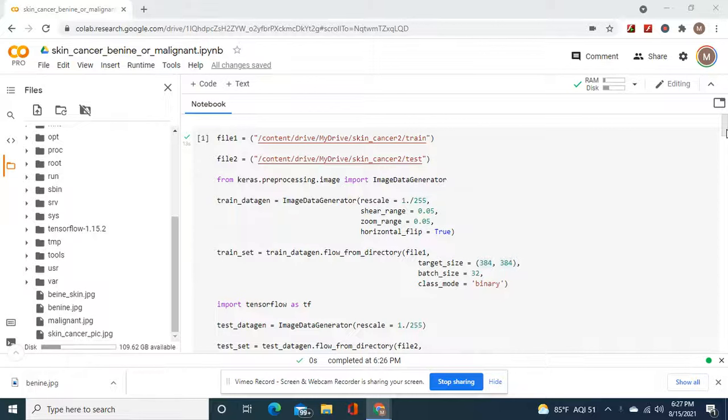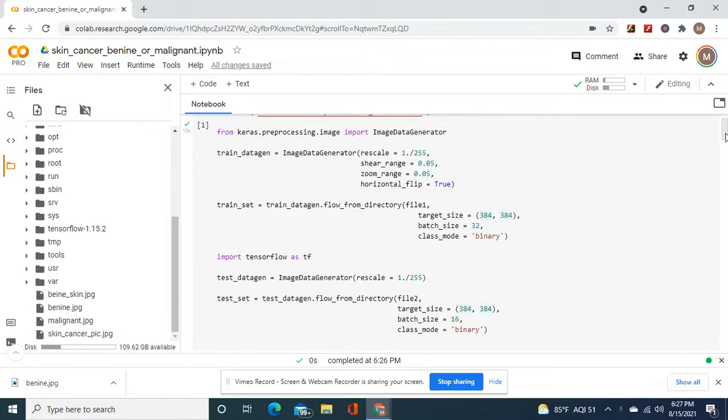Okay, guys, with real medical data imagery that you can get from Kaggle, you can get the skin cancer data set. You get a train folder and a test folder. We're going to build a cancer prediction model, because there are medical uses in AI, which you're going to see right now. Many doctors make mistakes with skin cancer imagery a lot. They misdiagnose it for something else.